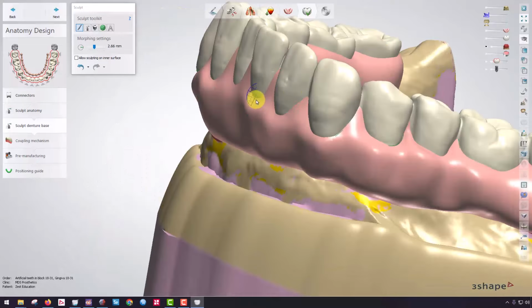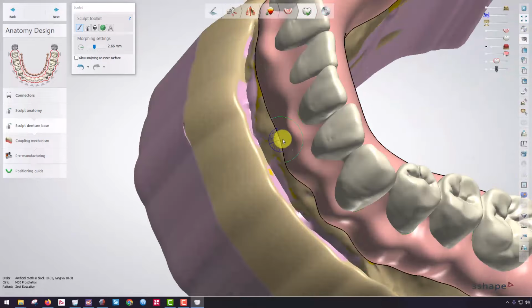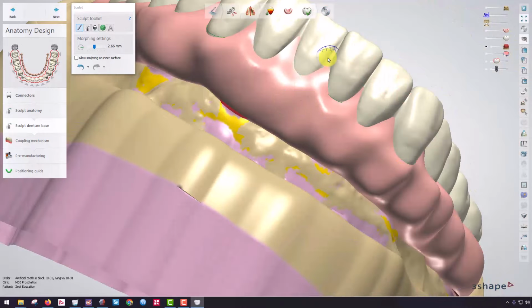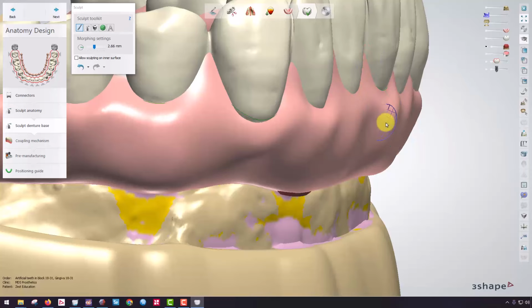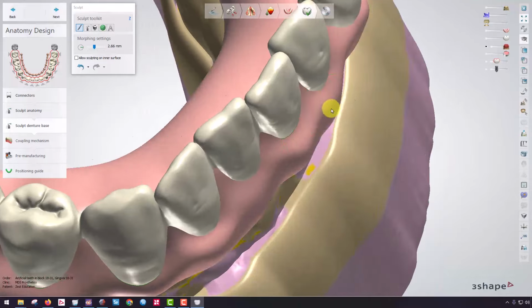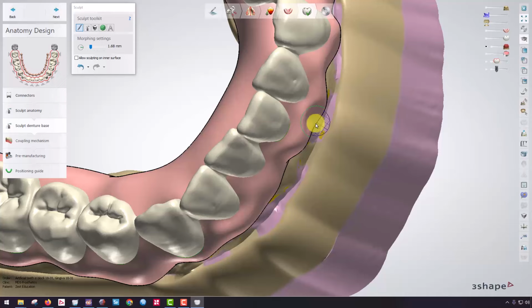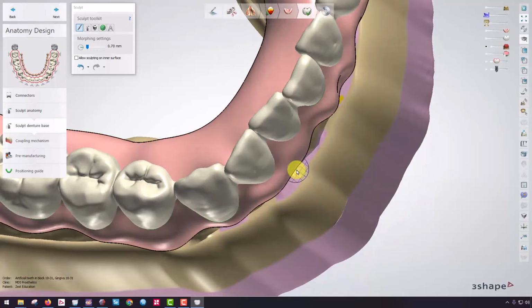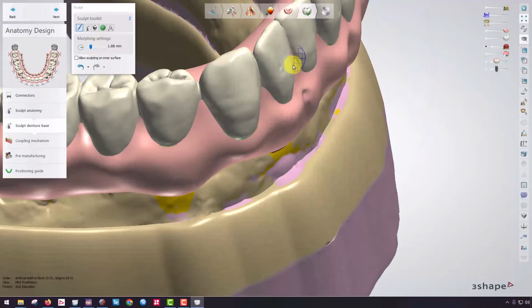Depending upon your type of manufacturing, some of you will 3D print this and then add some gingival composite after. That's totally fine. I'll bring my portions down just a little bit where the interdental papilla are, and then kind of build out that festoon area a little bit, but maybe a little bit right there. Interproximally, have them dive in just a little bit, make my part smaller here. And then right in here, I'll bring that in. And then same thing here, bring that down.